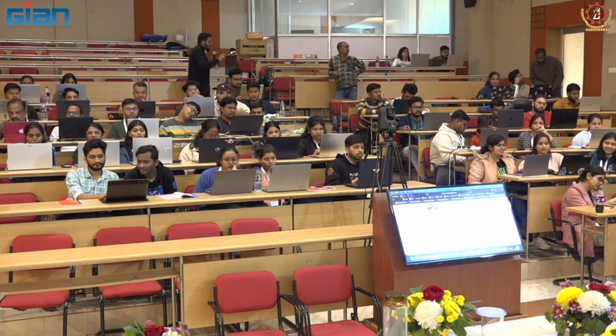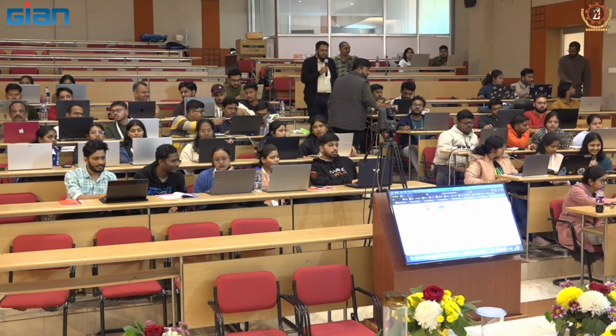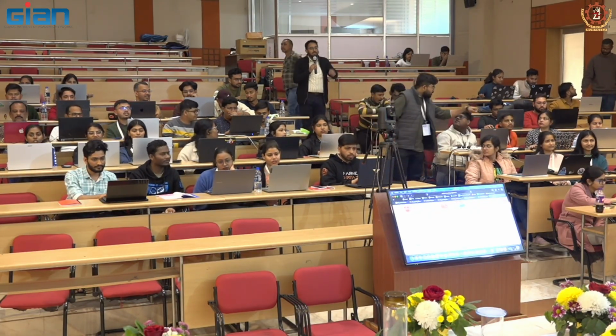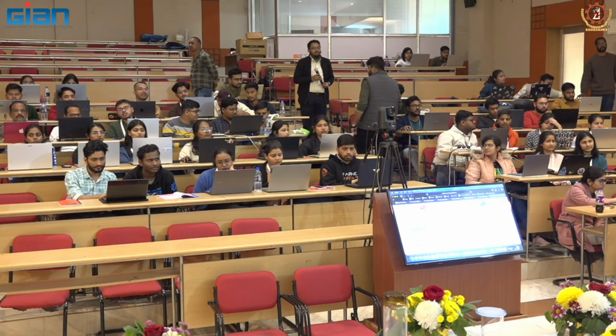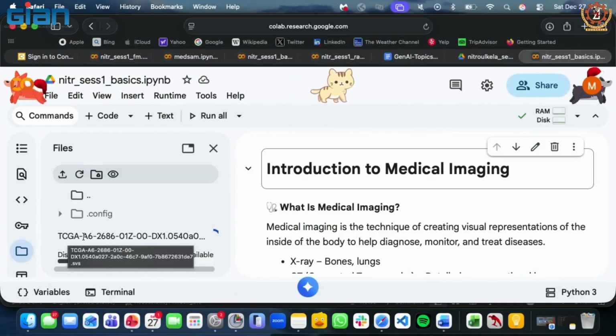It will give you a link, or you can go to Google Colab, colab.research.google. There is some link. So if you have downloaded, go to your Google Colab and then upload, right? Is there any specific file they need to upload? No, so as of now, you can upload the chest X-ray and the TCGA A6 file.